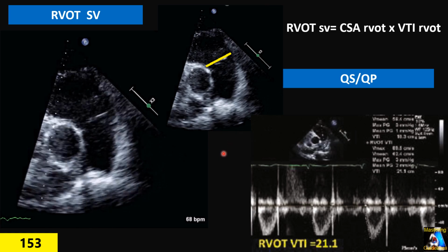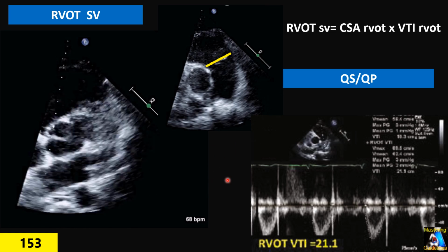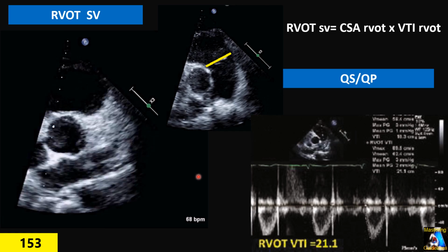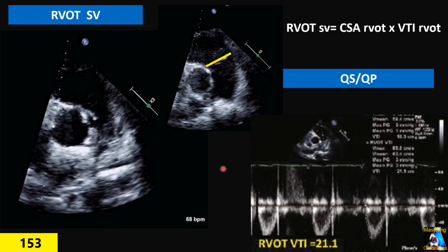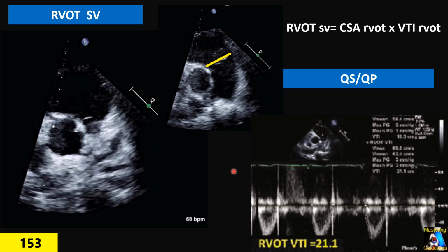In that case, this measurement helps you in many situations, especially valvular regurgitation and stenosis, intracardiac shunt, and so on.